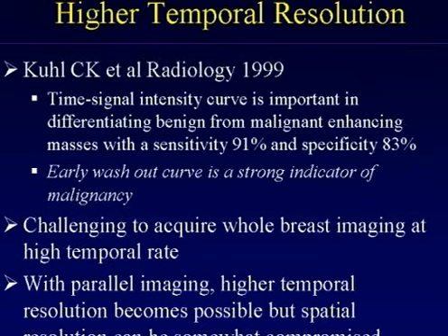So actually, at the 3T, now we think of another way. I described to you those mass internal enhancement. We're trying to see if maybe we can scan the whole breast at high temporal rate and just look at the same slice over and over again and try to see if you can make a visual gestalt analysis of the pattern of enhancement. And if you can do that, maybe we'll get a little bit more temporal resolution. And like I said, with the parallel imaging, these higher temporal resolution becomes possible.